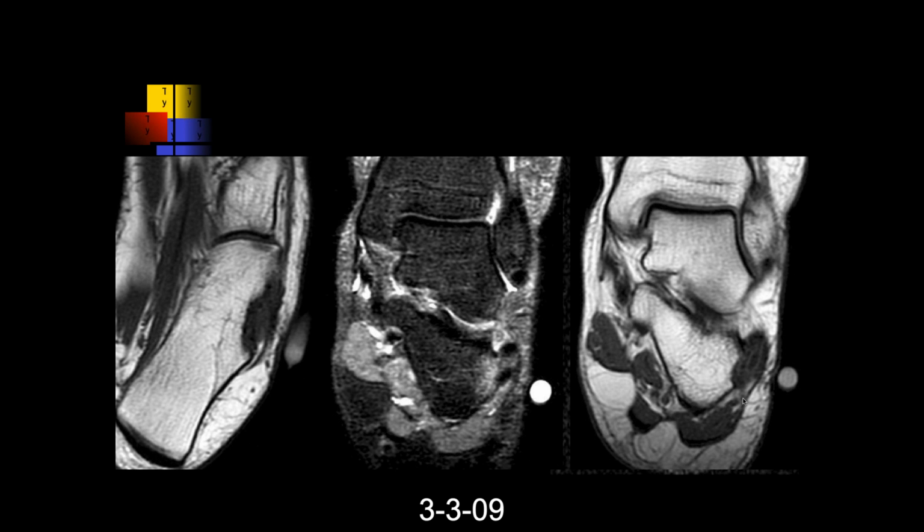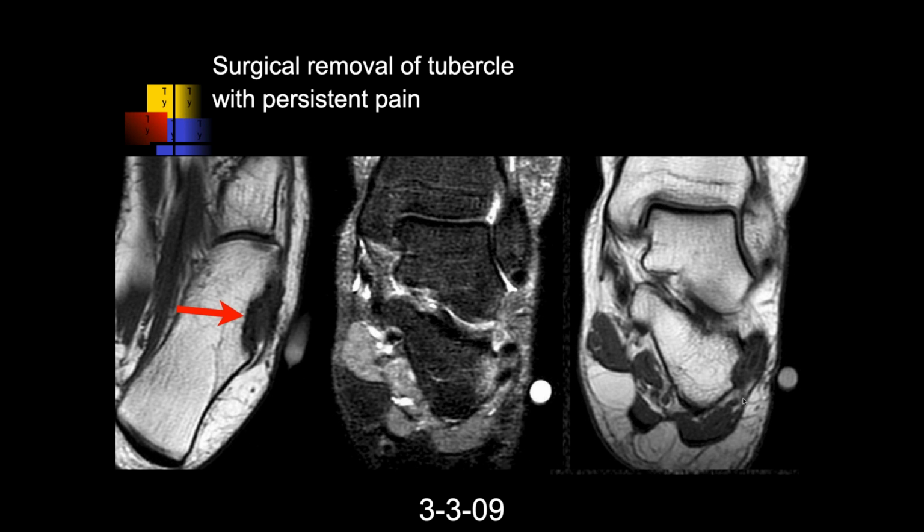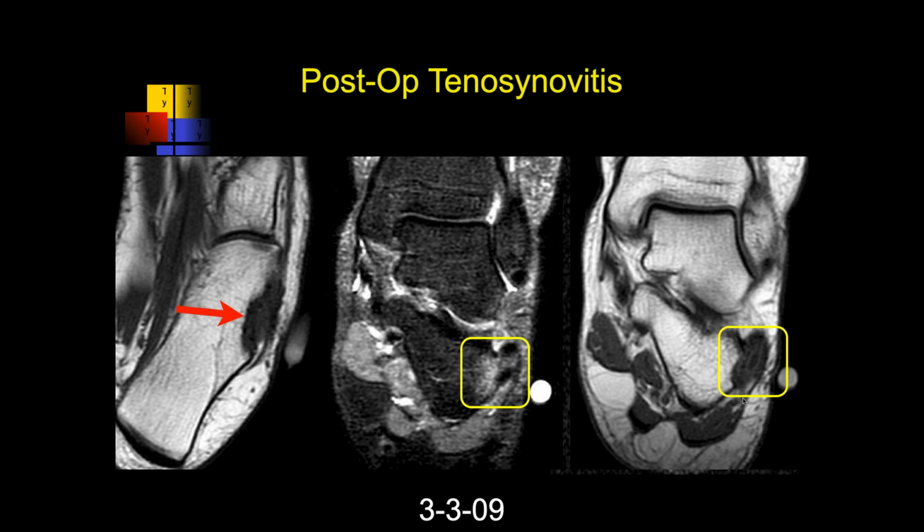Did they resect it? Did they take it out? Yeah. Okay. This is postoperative, and the patient continued to have pain after surgery, and we can see that there's a lot of bony reactive changes there, even after surgery, and some tendinopathy within the longus tendon.